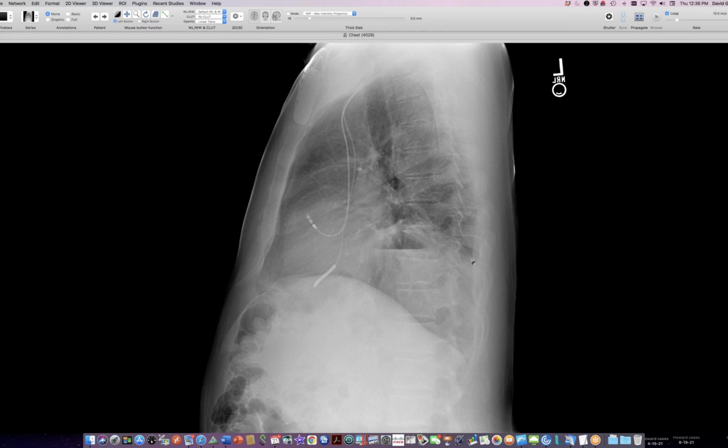And the elevation goes all the way to the back, which suggests, when the elevation goes all the way from anterior to posterior, that it's paralysis and not something like eventration, which tends to go back to normal height posteriorly. So this is paralysis. At the time this case occurred, I wondered, can COVID cause diaphragm paralysis? And there was no literature on it.